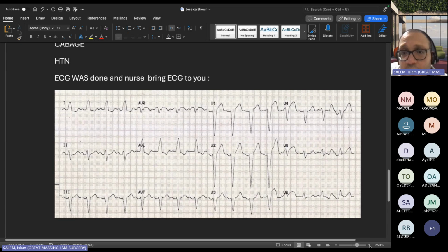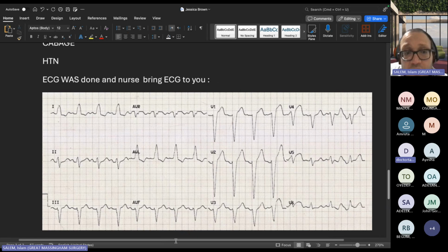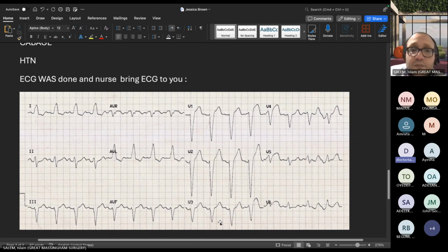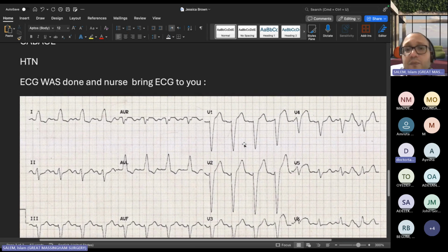I mean, because that's important. Applying this to real life scenarios is important. Okay, and you will meet that in your life. Like, here in V1, it's kind of borderline in one of the waves there.